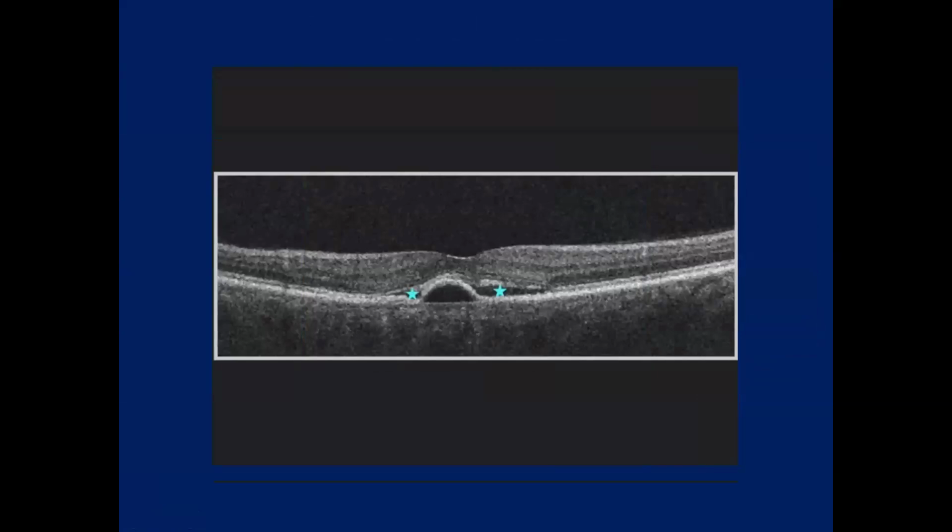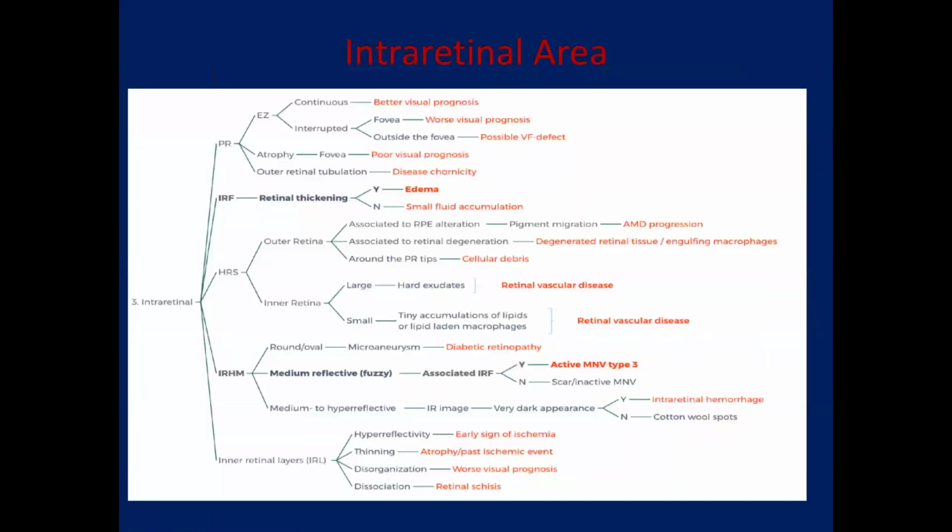So to differentiate clearly between the two, the blue stars are clearly subretinal fluid, but the one with the red arrow is sub-RPE fluid. So fluid that develops sub-RPE is most likely of AMD origin. Still, it can be AMD, but other differentials are there. So knowing the areas where things are involved is quite important to list out possible differentials.